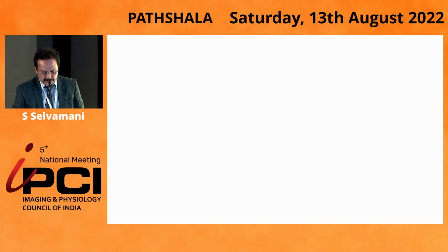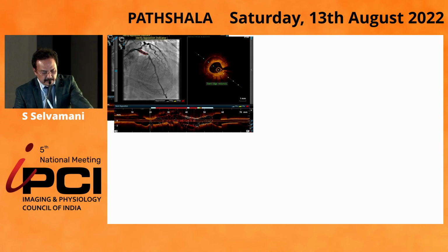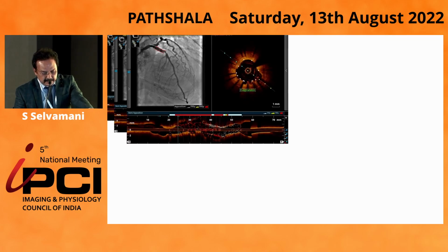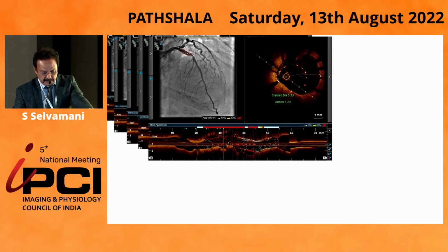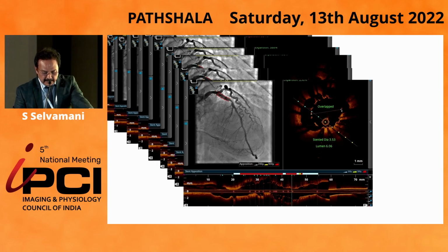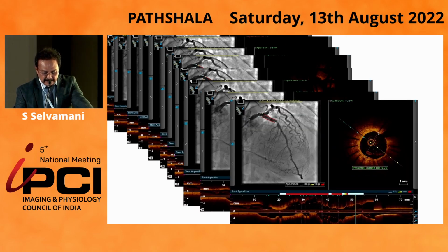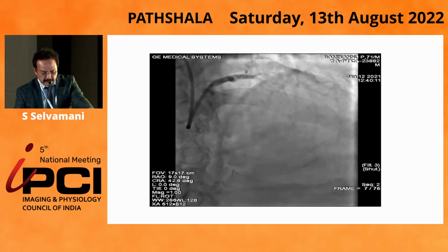So when you see this with angioregistration, just concentrate on this white mark, how to dissect your coronary and look into the pathology. See, there are areas of underexpansion and hyperplasia and significant malapposition here, a great malapposition at that area. And again here a malapposition, and overlapped areas are there in this case here. So this is what we see on imaging, very clear.